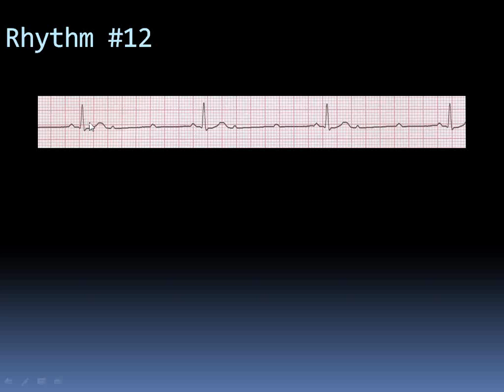You will have a QRS for a P wave, and then you will have no QRSs. There is a QRS, there is no QRS. There is no QRS. QRS, no QRS. So only 1 out of every 3 P waves. This is the first P wave. This is the second P wave. This is the third P wave. Only 1 P wave for every 3 has a QRS with it.